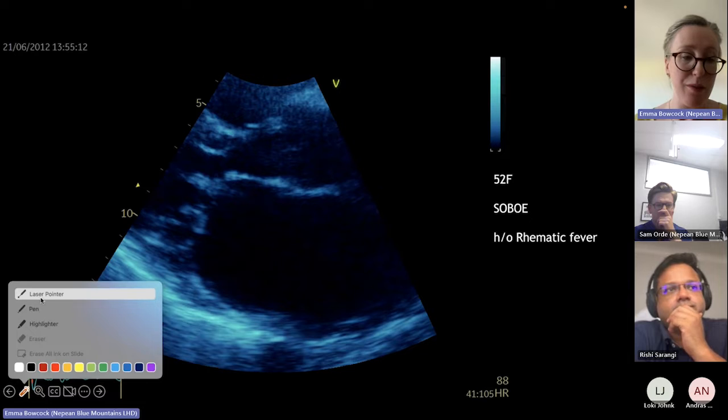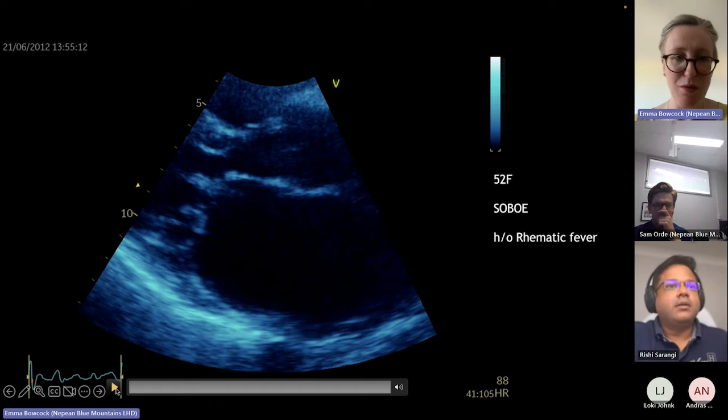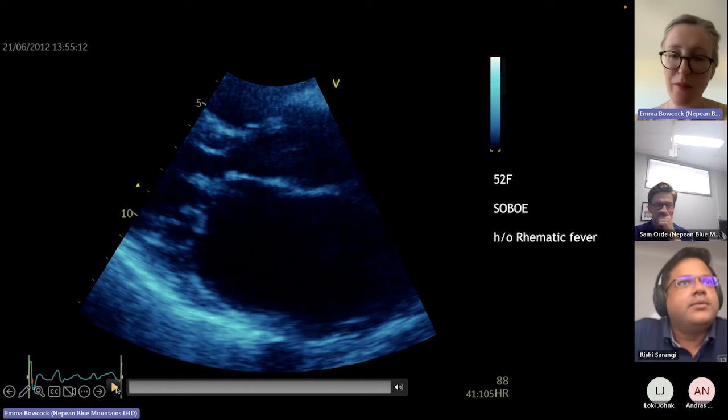Do I have any other volunteers just to practice? Rishi, perhaps you might want to just talk through this loop.